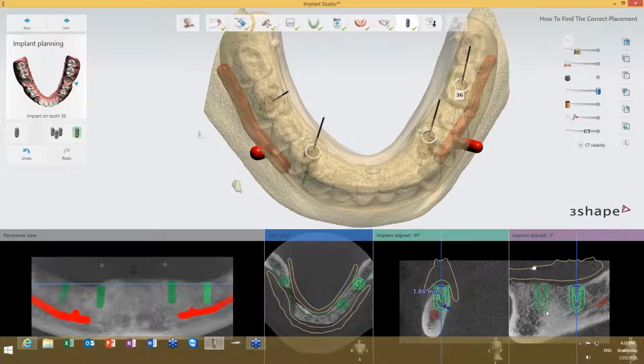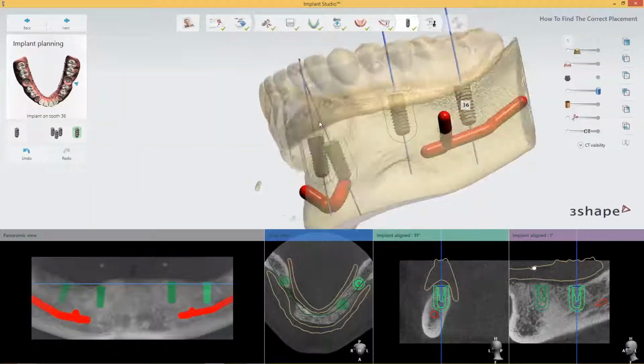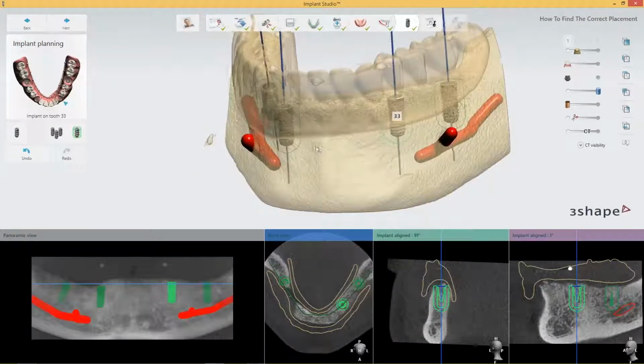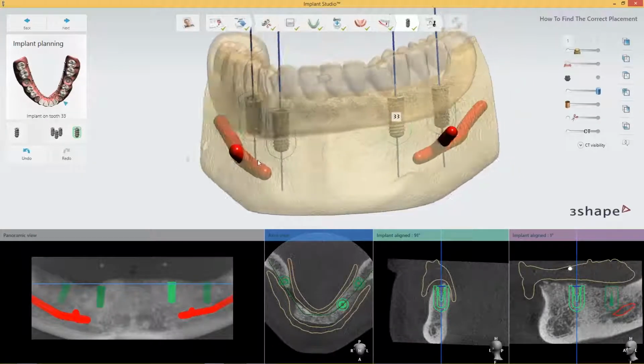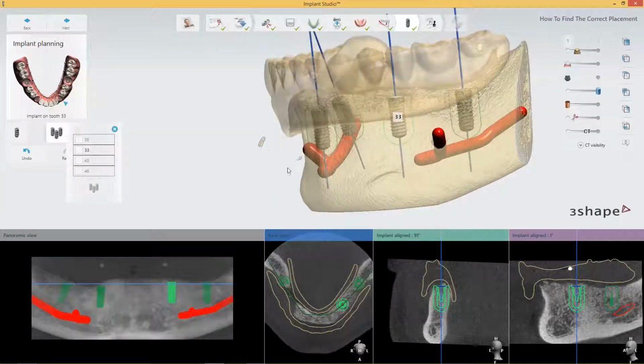Yeah, well, I'm glad you're asking. First, I think I just want to quickly get rid of this old. But we have ways of grouping implants, and basically the button is over here. And when we work on these large cases and it's a cross arch, then maybe I need your guidance, Jan, to tell me what kind of grouping would actually make sense here. But basically the functionality works by you can create one group, you can create multiple groups.